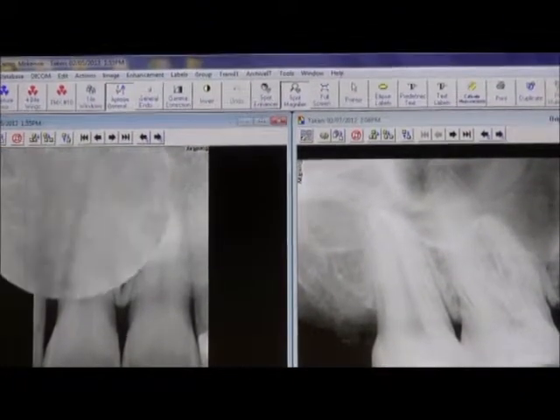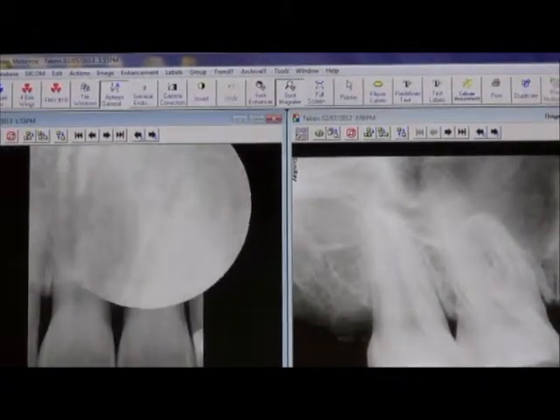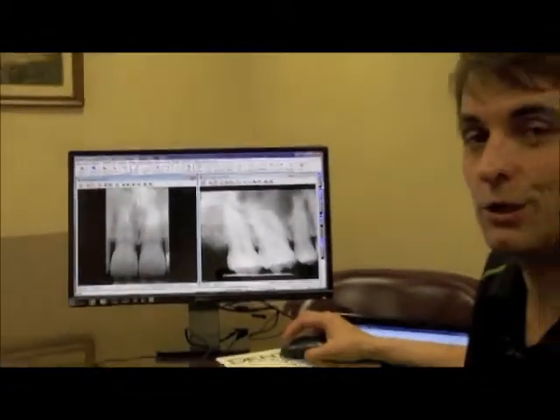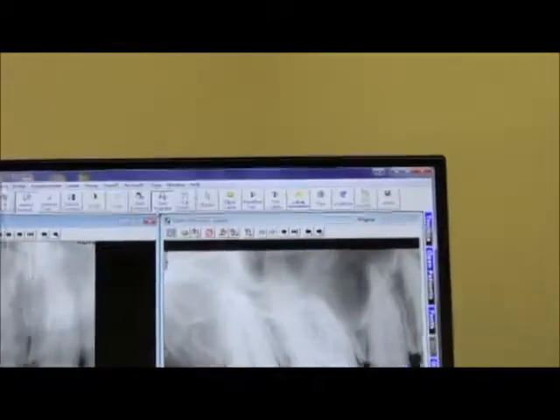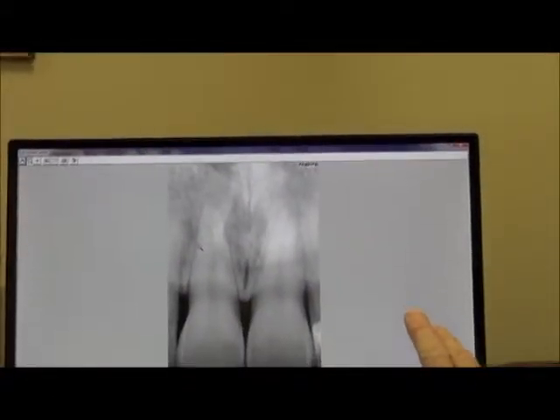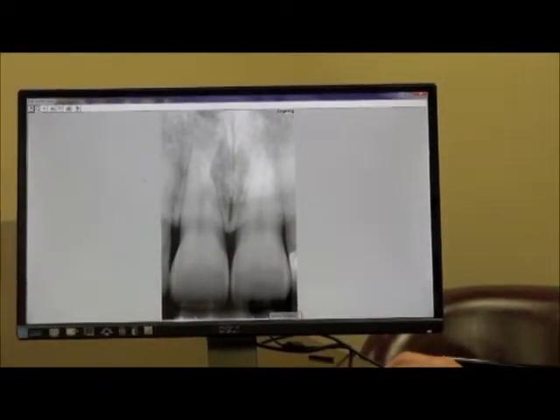Normally I say do not go beyond 3 times magnification because the information stops being useful. So typically 2 or 3 times magnification is good. Now here, this icon, the rest of these icons, this one is going full screen. So if you have an image and want to take it into full screen mode, you click on it. You'll notice my arrow has turned into a magnifier.